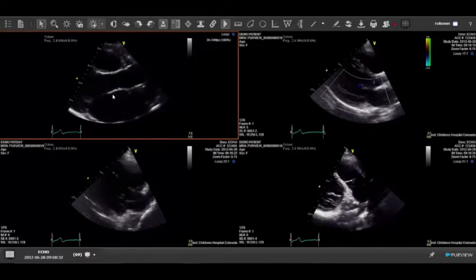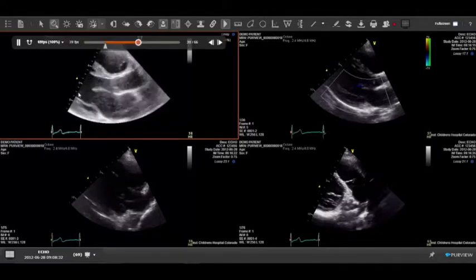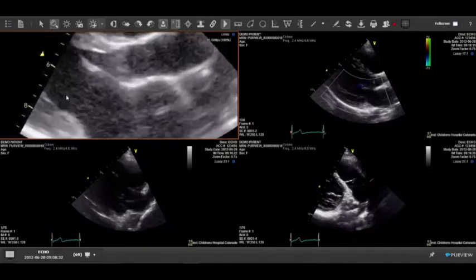To zoom the image, simply select on the zoom and pan tool. To zoom, we use our mouse wheel. This will zoom up our image. It'll also pan the image based on where the arrow key is. If I want to pan it around a little bit more, simply left click and drag will pan the image around.